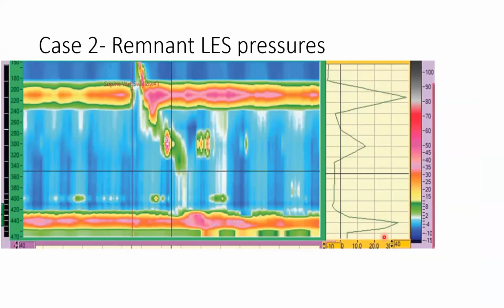Next, the cause. We saw the remnant muscle above. Now the remnant muscle is still at the level of the LES. So you have a POEM done, but possibly left a big muscle trying to achieve that small gastric myotomy.